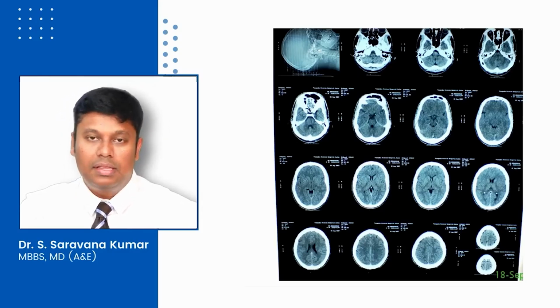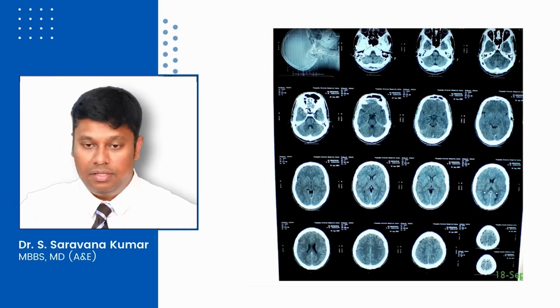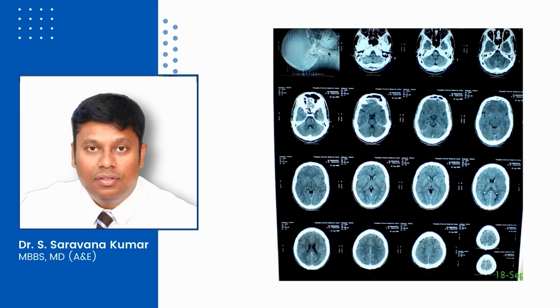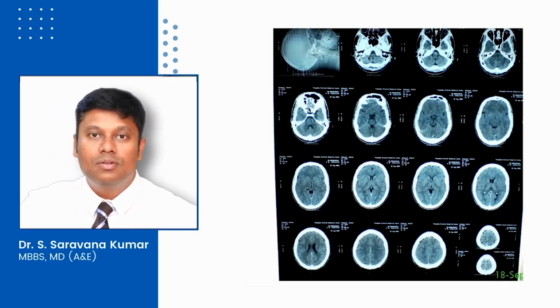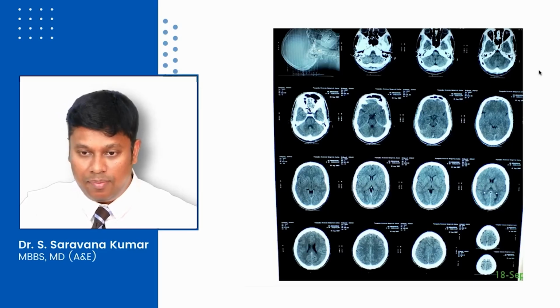Pay a closer look at the image which I am showing to you now. This is an actual CT image which you are going to get in any patient. So let's start from the first slide. Remember, what is the first one? It basically talks about the thickness of the slice, right? The axis, the thickness of each of those slices. Once you move from that, the first image is going to be your brainstem. The key to identify brainstem is to identify pons.